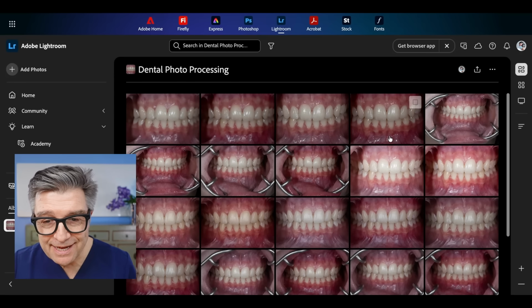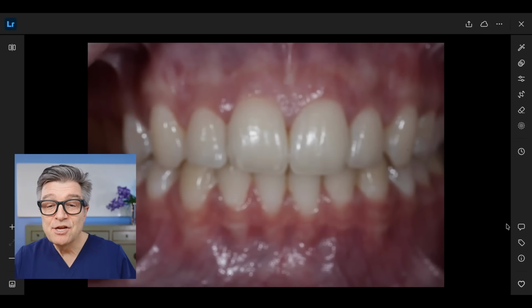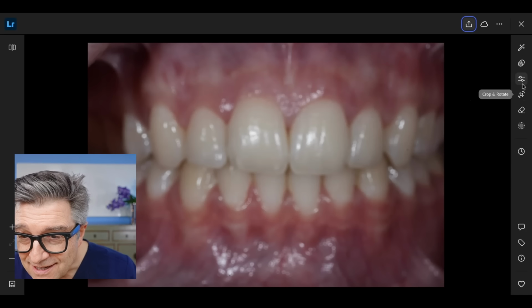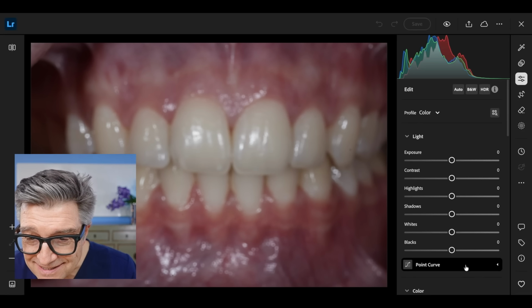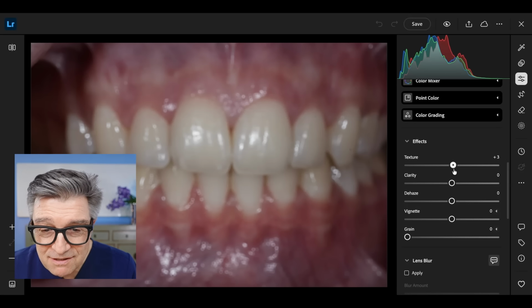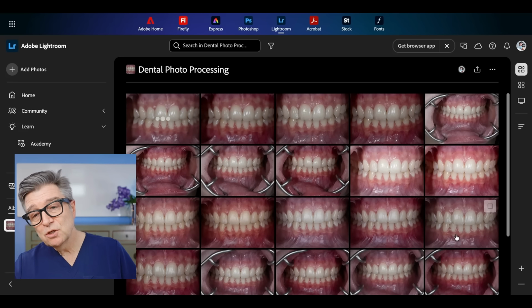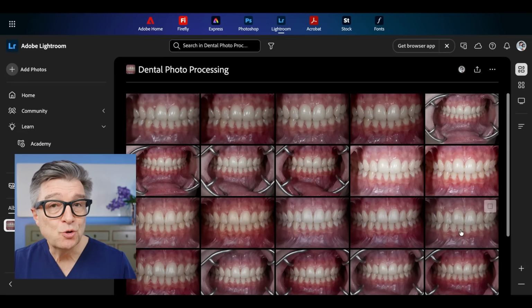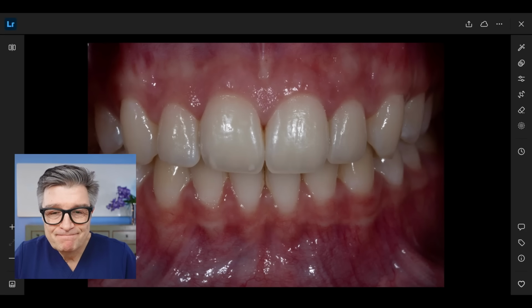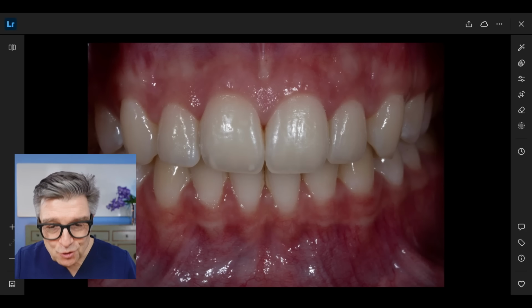And you see here a selection of images I have taken. We have talked about issues that cannot be solved. So if your shot is unsharp like this one, I'm not sure if I edit this and I want to make it sharper, it's not really helping. Better retake the picture. So what can we do? If you have framed your shot correctly, basically there's nothing really to do with the image.